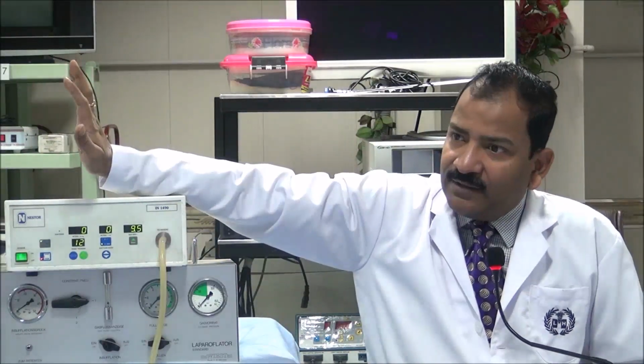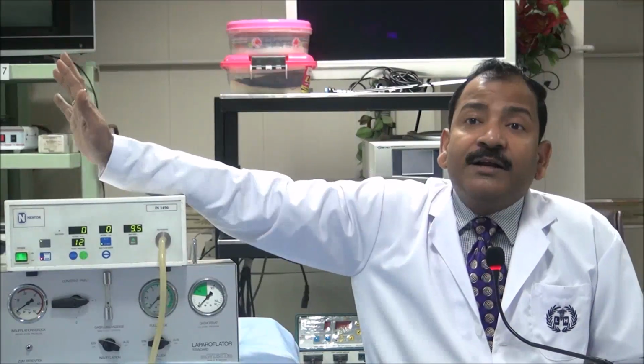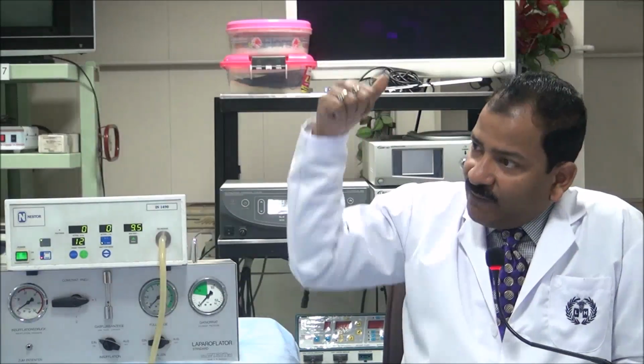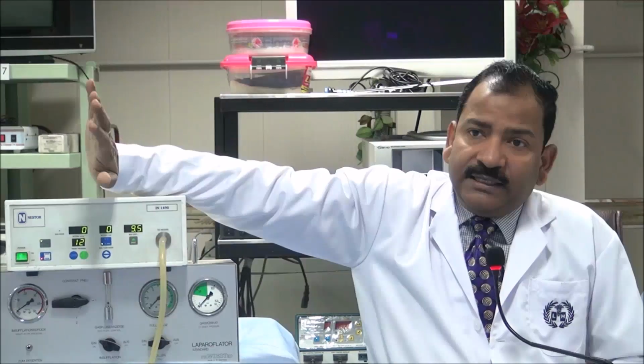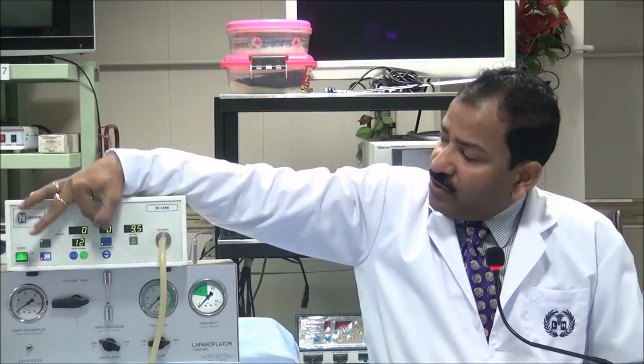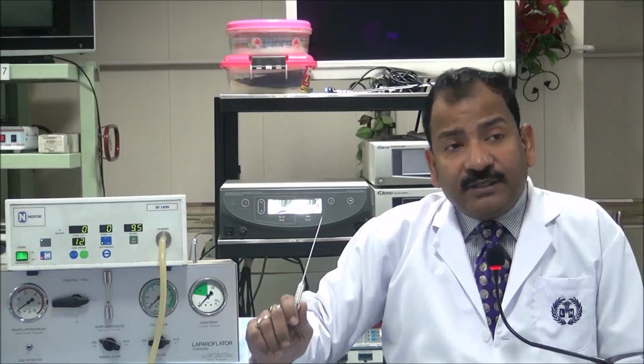Is it clear? So if I put this preset pressure to 100, then it can take 20 liters of gas also. It will be compressed, but the abdominal wall will burst, because 100 millimeters of mercury anyway cannot be introduced into the abdomen. So this is the total amount of gas used. Now the question is, how much is the total amount of gas used? Before putting the first trocar, it was 1.5 to 6.